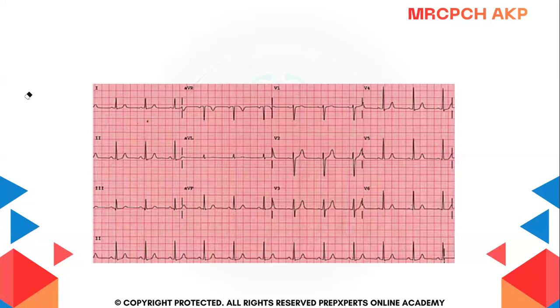So lead 1 is your left thumb. So this is the lead 1, right? And here we have lead AVF. Okay. So which axis is this? And I told you up means positive deflection, or you can say upright. So this is going up. The R wave, basically we are looking at the direction of the R wave, right? So this is up. So your left thumb is up.